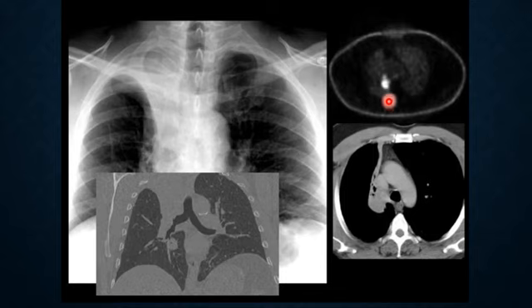So you may not always see the lesion as a big, ugly looking mass. Sometimes it might be small but obstructing. Okay? Again, the S sign of Golden alerts us to the possibility of the presence of a right hilar pathology, most of the times a malignant one. Okay?